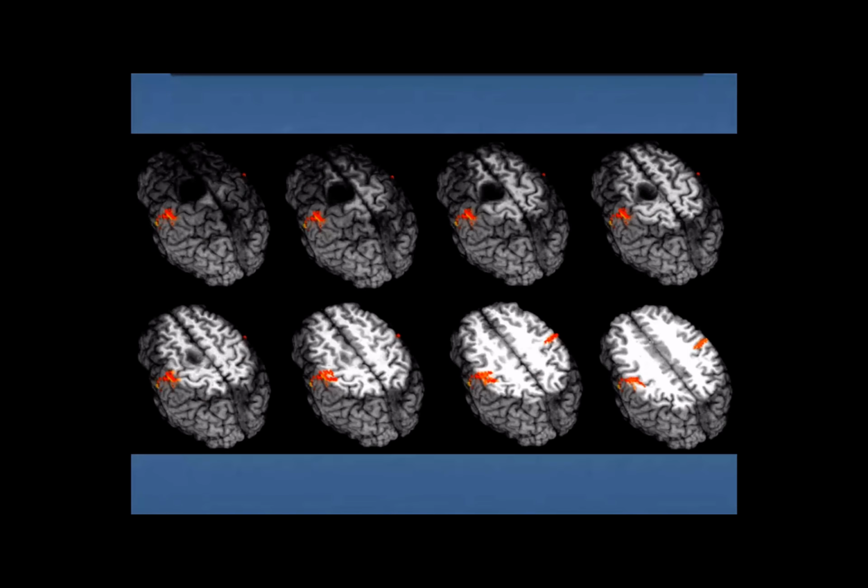In the other section, we can find the finger movement function area is beside the lesion, and if we resect this lesion, we should avoid injuring this area, the movement function area.